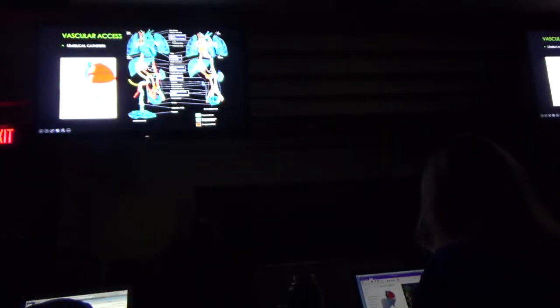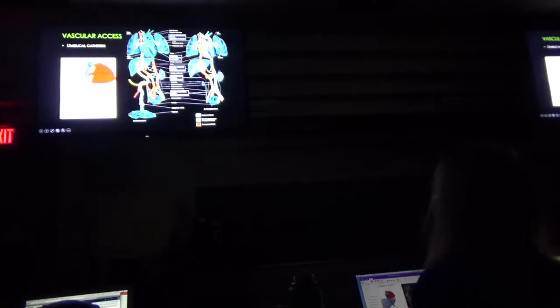Now, when you get to this area here, see this junction that goes straight across the hepatic portal vein instead of going into the inferior vena cava? That is probably the most important thing that I would want you to know. Because if you start an umbilical line and it's going north, once you start going north, it should continue to go north and end in a northward fashion.